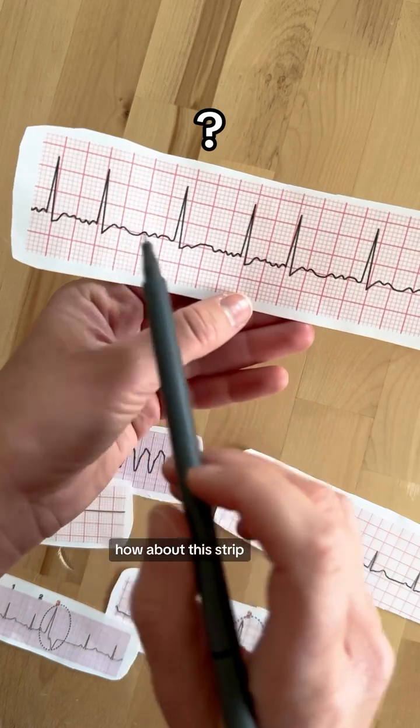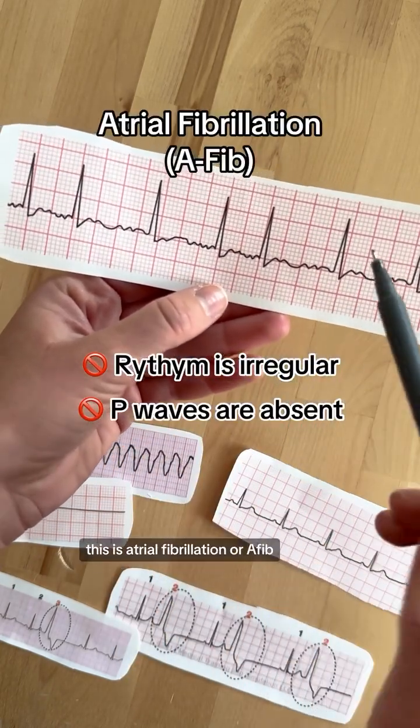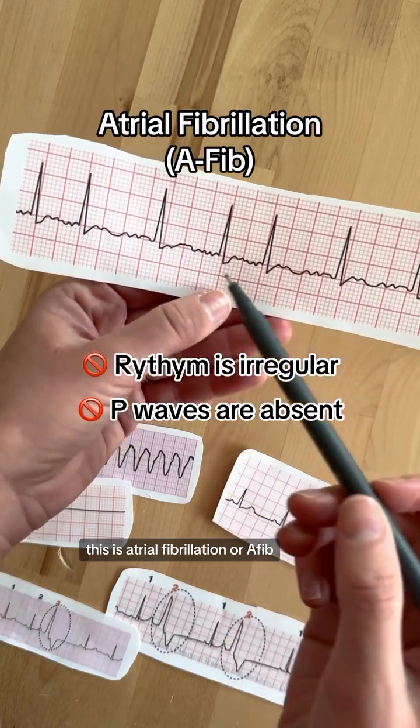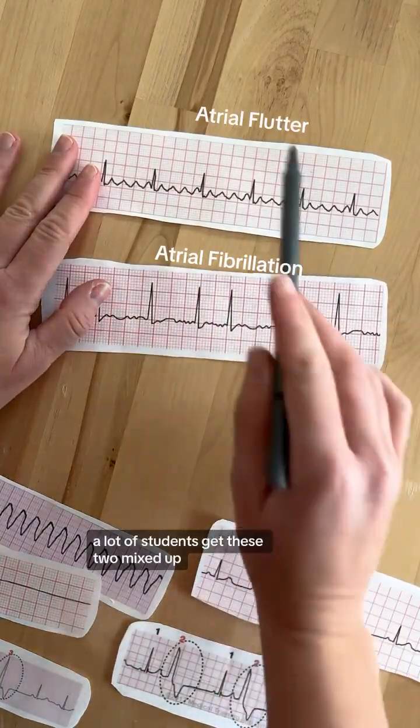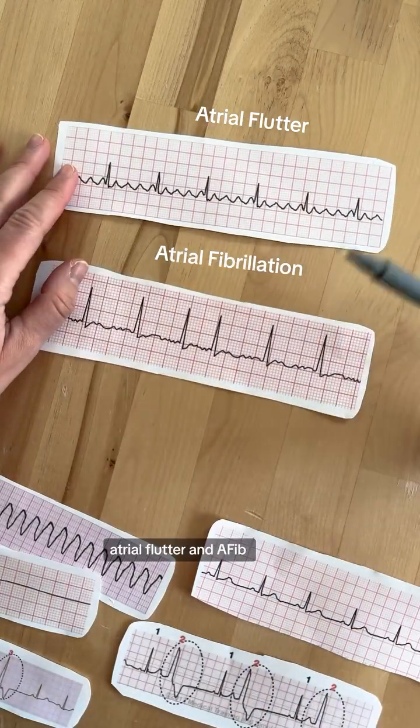How about this strip? The rhythm is irregular and the P waves are absent. This is atrial fibrillation or AFib. A lot of students get these two mixed up, so I'm going to tell you how you can notice the difference between atrial flutter and AFib.